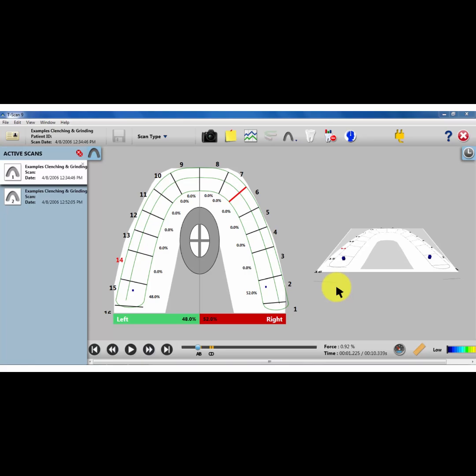In this case, the patient had 4 CEREC restorations placed on teeth numbers 12 to 15, inlays and onlays, and number 14 was a crown. After the insertion, the patient was unable to chew on tooth number 14 without it hurting, and he went back to his dentist, who made adjustments to tooth number 14, but was unable to resolve the pain using conventional methods such as articulating paper only and visual observation of the occlusal surface of the crown.